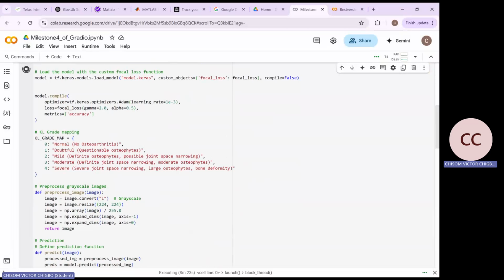Because when you want to communicate with computers, especially image-wise, you have to be very consistent in your size, your format, and whenever you want to manipulate the images, I'm pointing at pre-processing in grayscale now, okay?